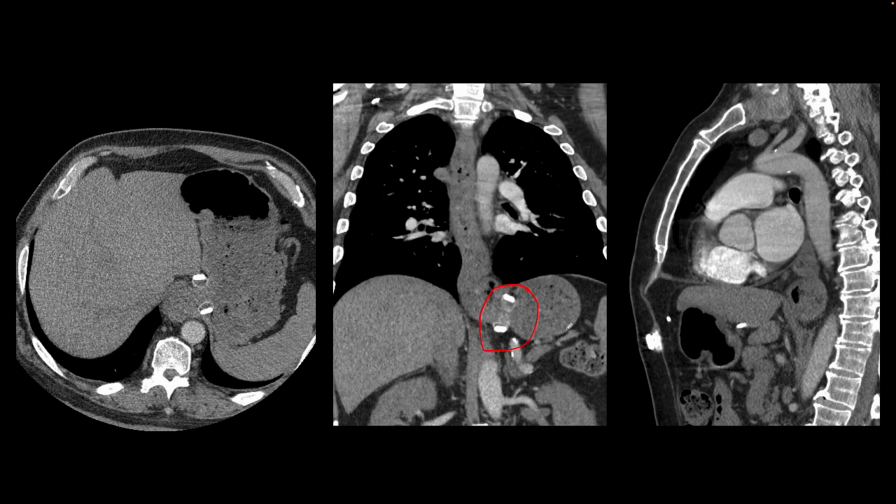was too tight, because of which there was obstruction, and food material that they were ingesting would not go through the gastric lap band into the stomach. And so there is stasis of ingested food in the esophagus, and that was causing their chest pain and shortness of breath. In these patients, there can also be signs of aspiration.